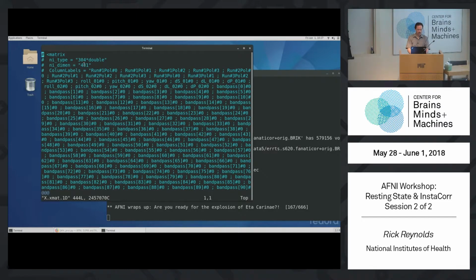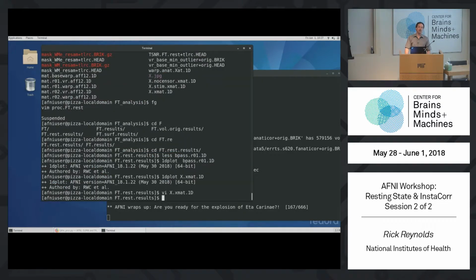So we've got 431 time points after censoring and 304 regressors. So we're removing a lot of degrees of freedom for the band passing operation. It's not magic. It's not just, oh, Fourier, it's elegant, it's just a quick step. It's a very costly step. You can do it, but it's costly.